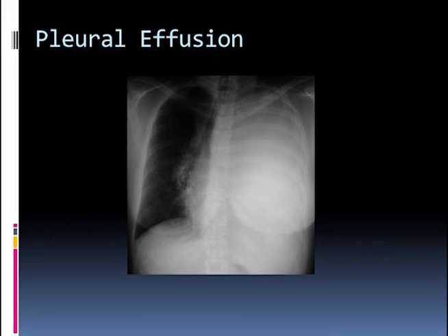On the other hand, when you have a pleural effusion, what happens is you get increased volume in that portion of the lung, and it tends to shift the mediastinum over towards the other side. Here we can see the trachea coming down and the heart all shifted over towards the right. Can you see the stomach bubble, that little bit of air there in the upper abdomen? This is the stomach bubble. The diaphragm should be right above that, and everything on top of that is fluid. So this is increased volume caused by a pleural effusion.